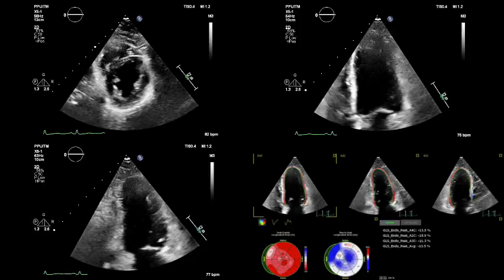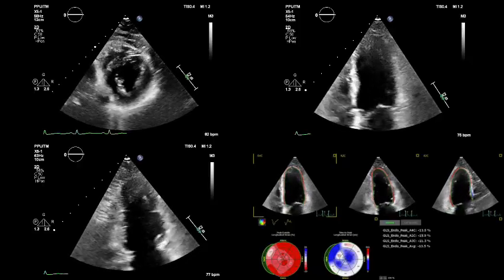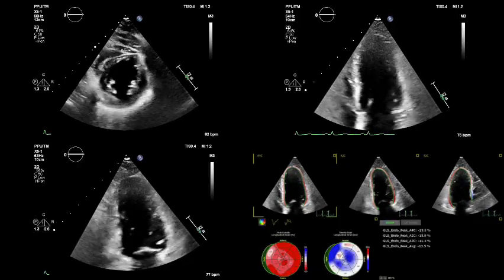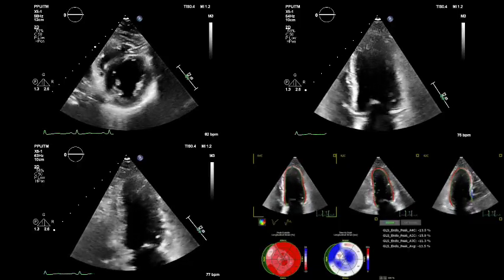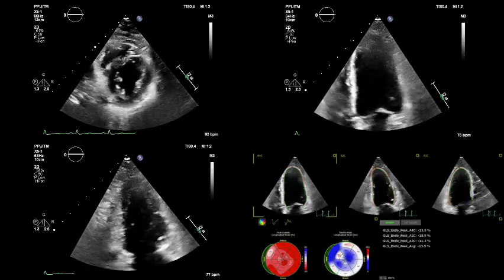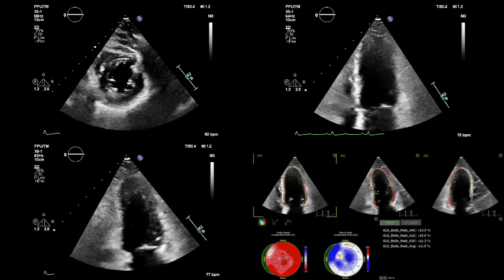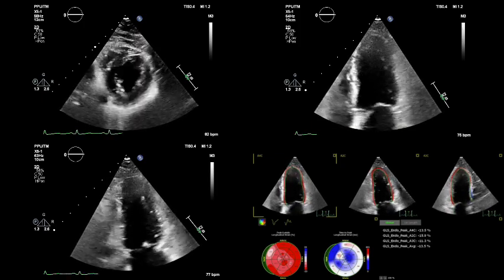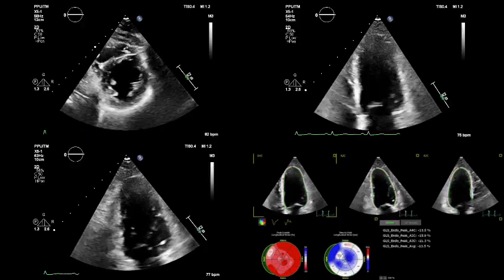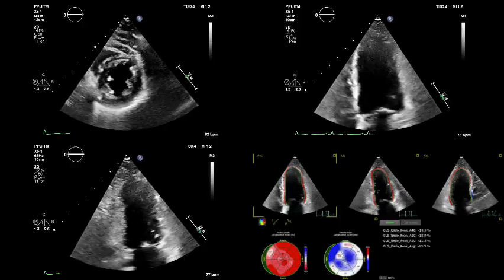Okay, so some examples. 50-year-old woman referred to me for cardio-oncology assessment pre-chemo, doxorubicin because breast cancer, EF 55%. What do you think about the EF? Oh, but I measured already 55%. But doesn't feel right? Yeah. So there are some regional wall motion abnormalities. So remember I said the geometric distortion and all that, EF is not very good for that, right? So it doesn't look that healthy.